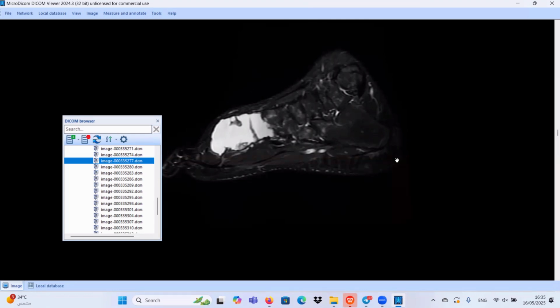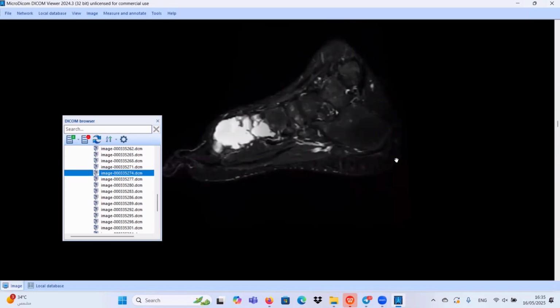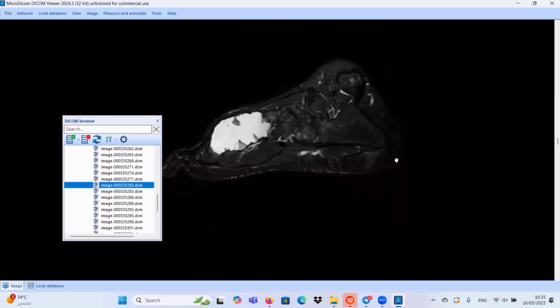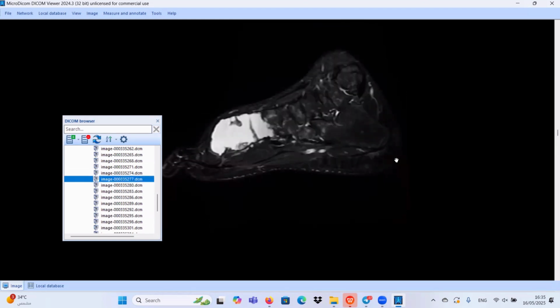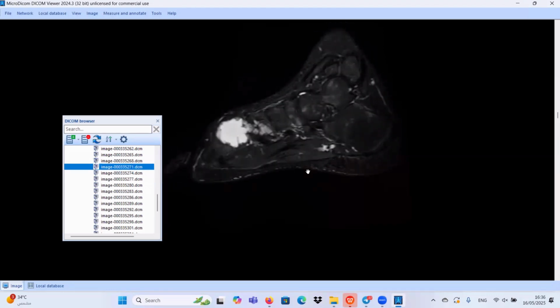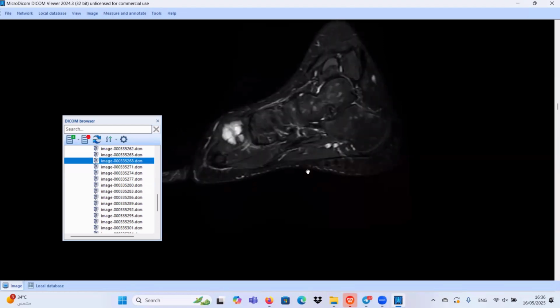So I believe this is a single lesion. The underlying muscles are also showing some increased inflammatory changes in the sole of the foot. So next, in my routine practice, I would see the rest of the imaging to see its relation. I would also like to have a post-contrast study to see any soft tissue component, although I can appreciate that there is none at this level.